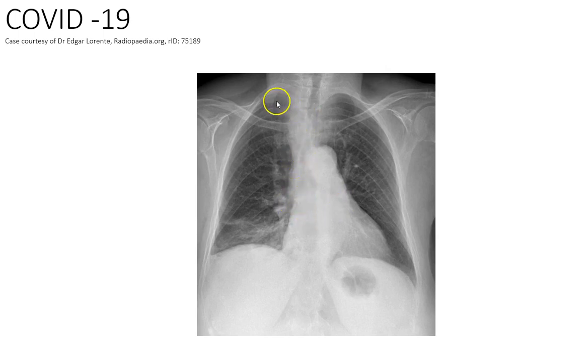And then I'm looking at my lung markings, and I can see them all the way to the edge, but I can see this slightly increased area here, and this side looks fine. And I would say that this person is in the stage where they've got some pneumonia due to COVID, and so you've got thickening of these airways, and perhaps some atelectasis. They've perhaps squashed down a bit as well. So you've got thickening of this area of the lungs.